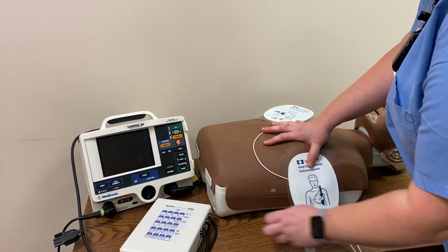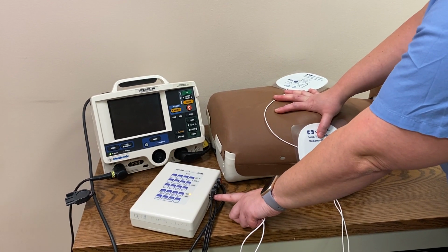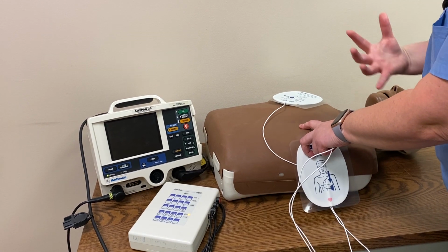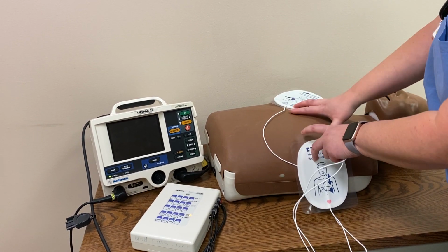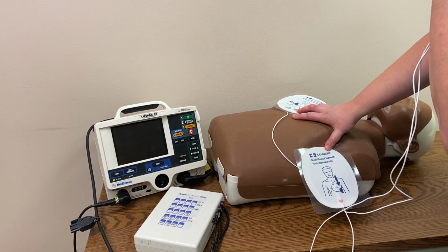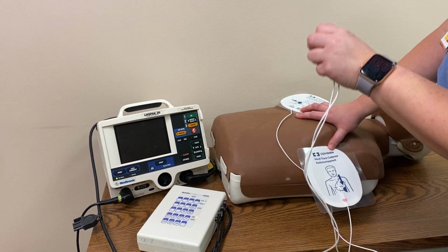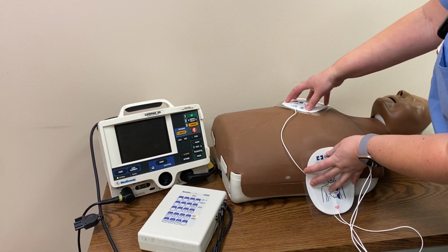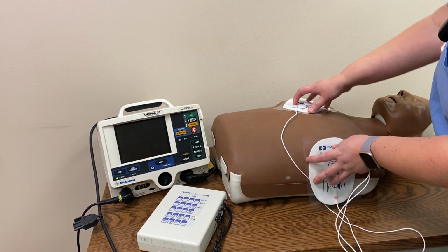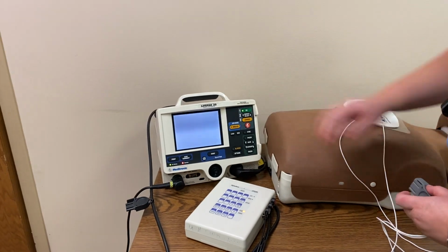Then you're going to take the 3 leads. I have them on my simulator right now, but you do need to make sure you have the 3 leads also placed on your patient. If the patient's symptomatic, they might be very diaphoretic. So getting Tegaderms and making sure those are on the skin and adhered well is going to be important, because your 3 leads are going to sense and your defibrillator patches are going to pace your patient. So once you have that set up, you're going to turn on your monitor.